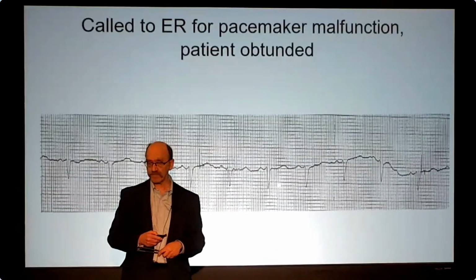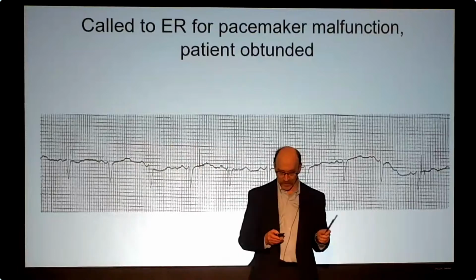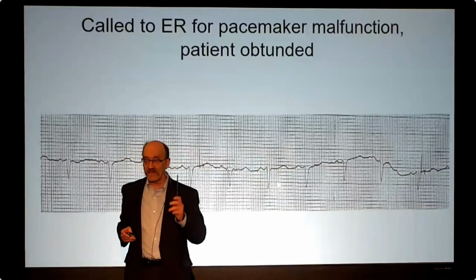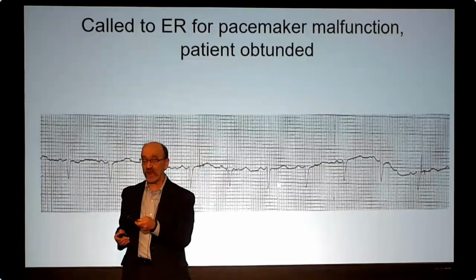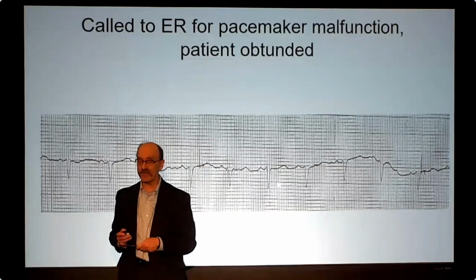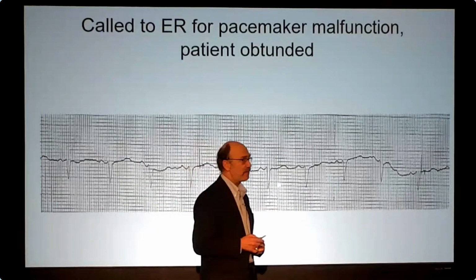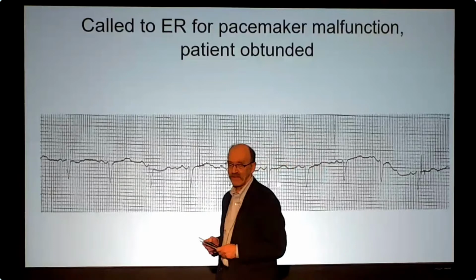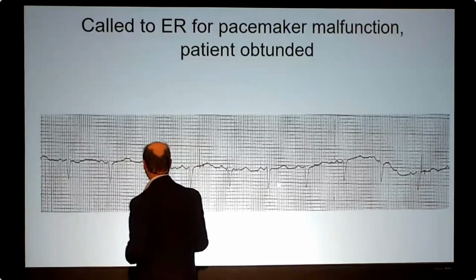Now, here's another pacing spike one. And this will be the last one because Eric's really going to complain about this one. Like I didn't on the other two? Okay. This one was actually, we were called to the emergency room for a patient who was obtunded about a pacemaker malfunction. And I bet you I know what it is. It was hard to see the spike, but it's there. There it is.